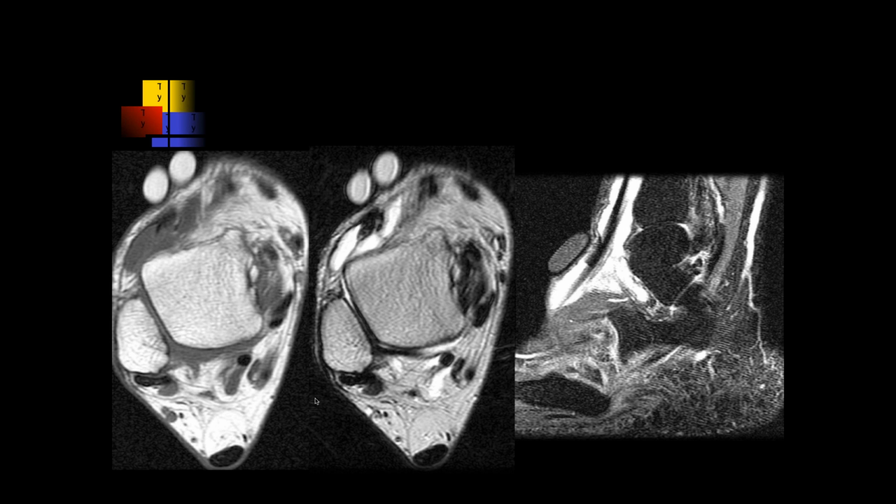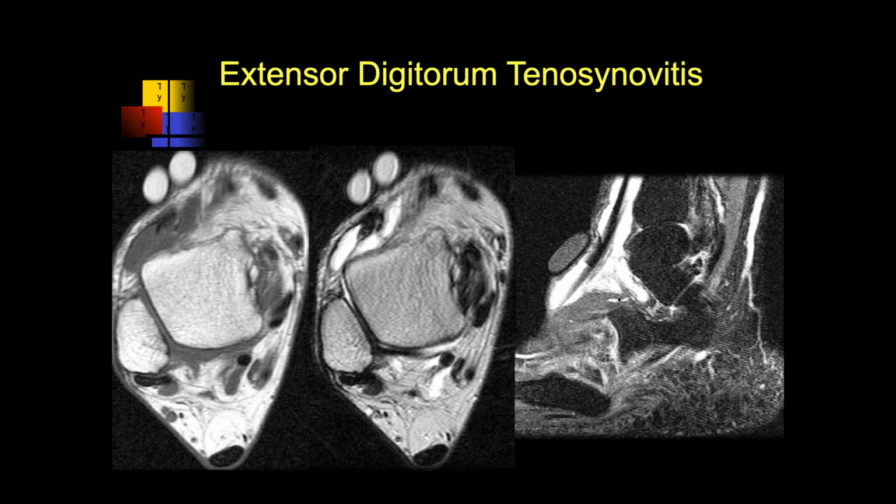Okay, so here again there are two soft tissue markers along the extensor digitorum, and it looks like there's at least some partial thickness interstitial tearing. Maybe on the sagittals it almost looks like there could be a full thickness component. I'd want to follow it down and see if it's full thickness distally. But it was a partial tear with tenosynovitis.